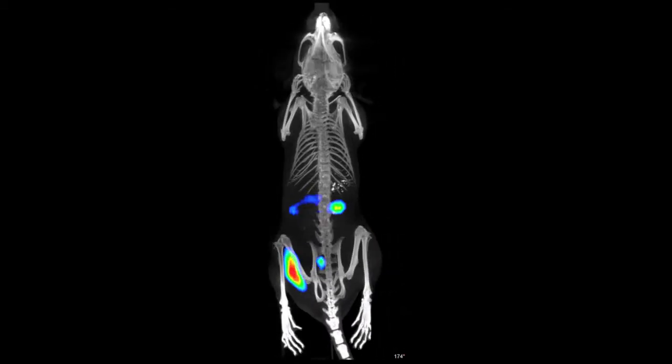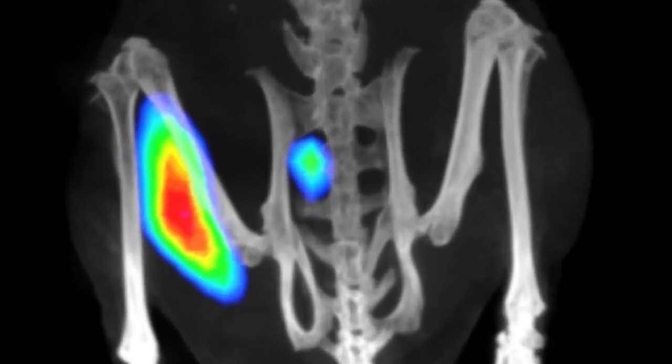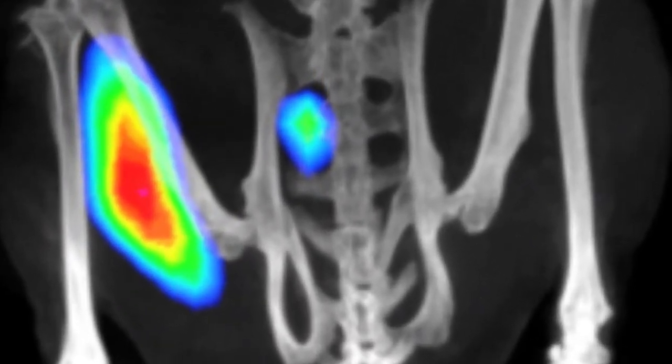Now we're zooming into the infection of the thigh, and you can see these bacteria, and you can see this energy, which is what the PET imaging system captures, which is coming from the bacteria. And the energy is coming from the bacteria because the bacteria love this new tracer that we have developed, which is now accumulated at high concentrations inside them. And now this tracer is emitting energy, and therefore the PET scanner can now localize where the bacterial infection is.